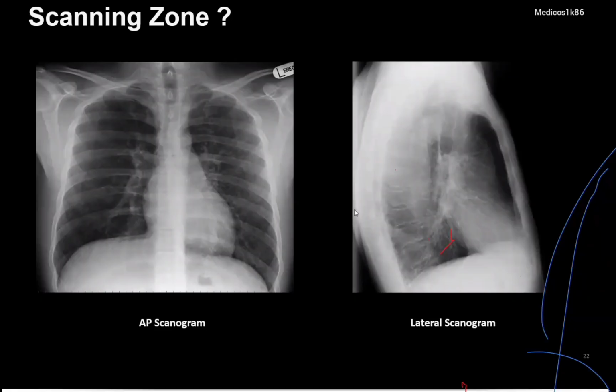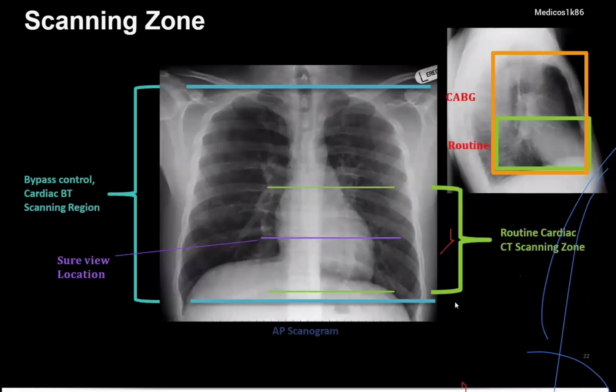And also, let me show you another image. This is our coverage region. This is the green line. It is showing the standard cardiac acquisition. When you cover from the upper part, from the carina, to a little bit below the heart border, then you will never cut the heart. And this is the heart anatomy on the 2D images. Also here you can see that you will never cut here, and always keep your rectangle in the front, because the heart, as I said, is in the front.